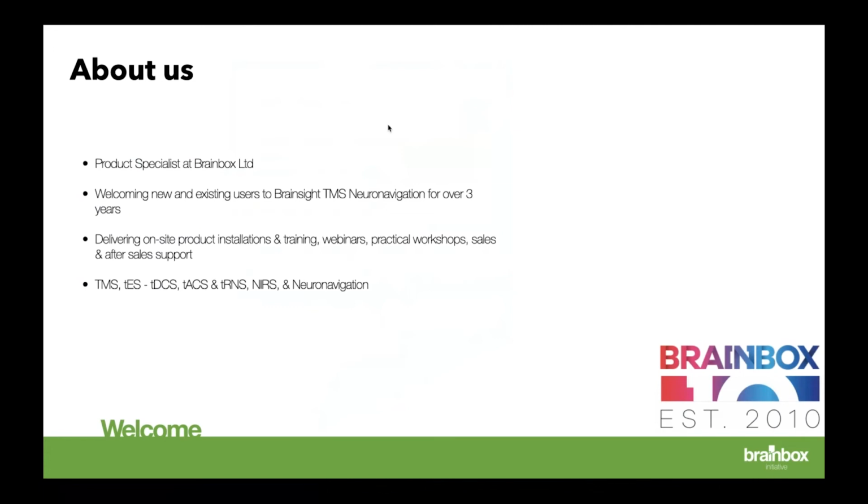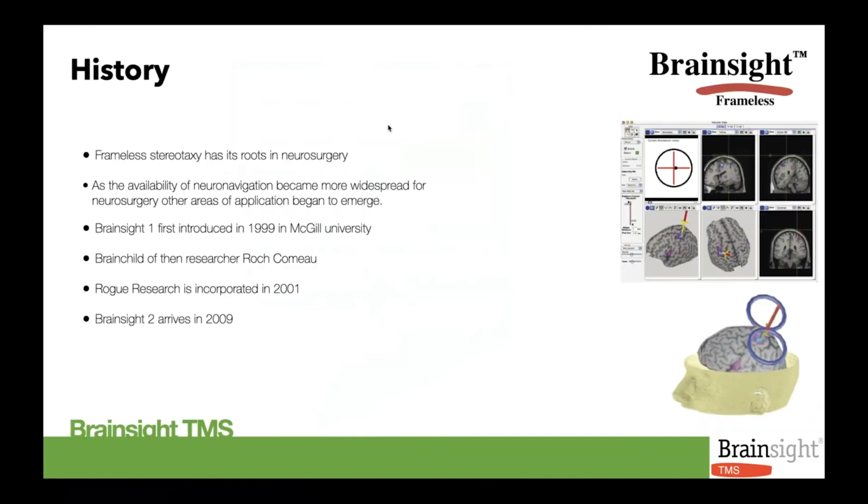There you go. Lovely. Okay, let's get things going. So before we get into the real nitty-gritty, let's give you a quick overview of Brainsight as a system, like what it is. It's a software which takes its roots from neurosurgery, so the frameless stereotaxy. So without having to physically clamp a frame to someone's head, it's that image-guided type approach.